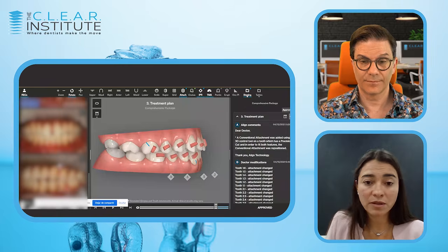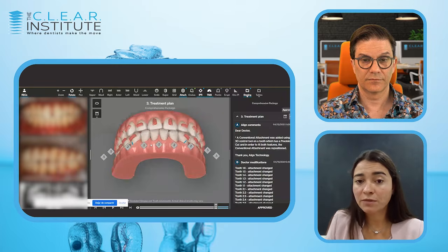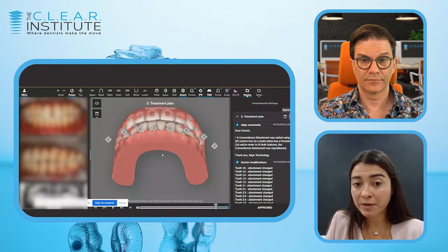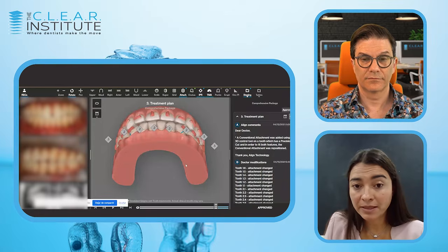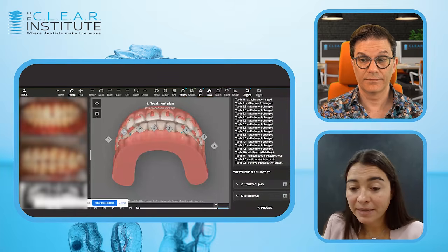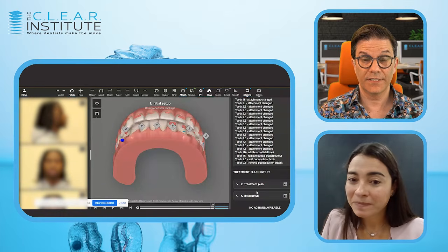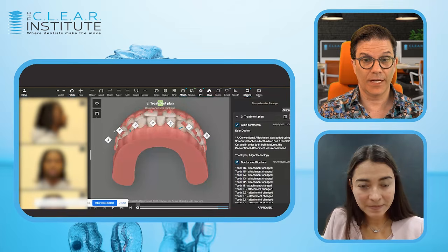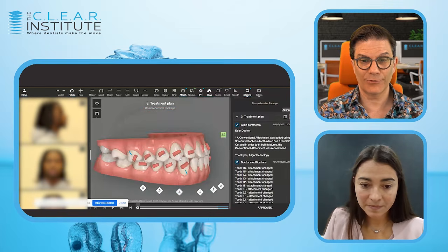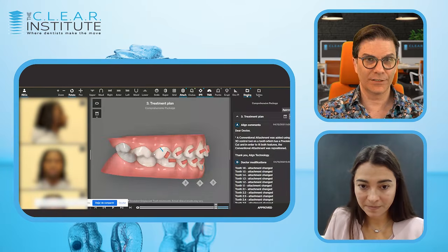And at the end, of course, you have with Invisalign the capability of seeing the images right next to your plan, which is very nice. But you can see that we've made lots of changes to this case to improve the predictability, to improve the long-term stability, to remove unnecessary movements, and we achieve a treatment with more than 10 stages less, in less time. It's actually 15 stages less. I guarantee you, if you would do the case with the first setup and then with this treatment plan, you would have completely different results.